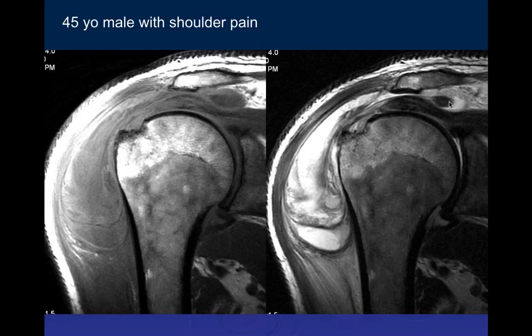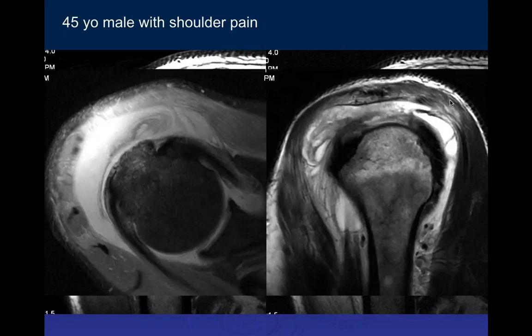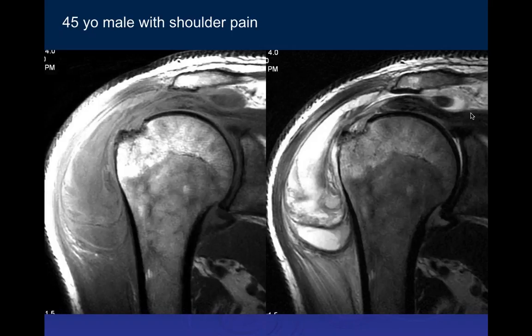So this is probably a mechanical full thickness tear. Here's the sagittal, and again we can see a lot of thickening here, the synovium. This is really a full thickness defect in the tendon. The musculotendinous junction's way back here, so this is really a full thickness tear. The only question here would be whether this is scar tissue that's developed in there, but in this particular case, I think this is a complete tear, with just some scar tissue there.